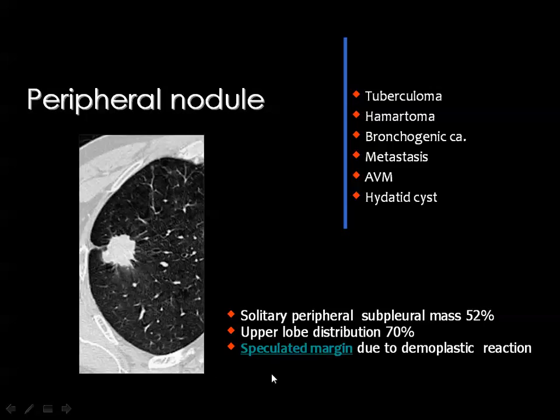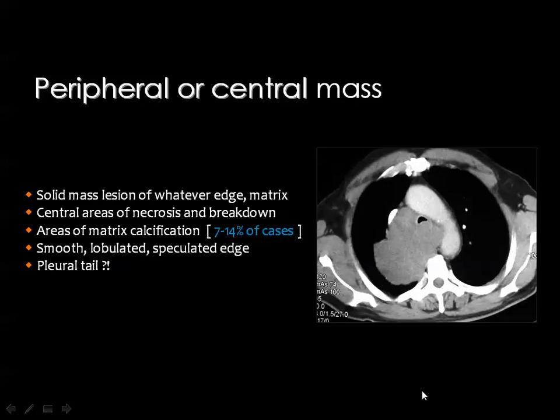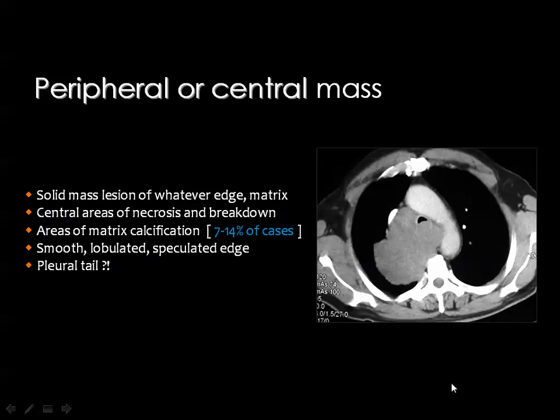And we usually try to differentiate these nodules in particular from the pulmonary arteriovenous malformation, because one of the next steps for evaluation of the nodule is to have a biopsy from this, and we should exclude for sure that this nodule does not represent a pulmonary vascular malformation. An AVM is easily diagnosed by the presence of a vascular pedicle, which appears as two cords, the feeding artery and the draining vein going from the lesion to the hilum.